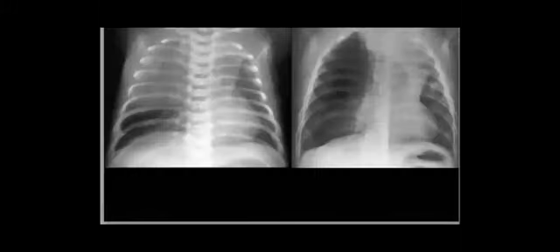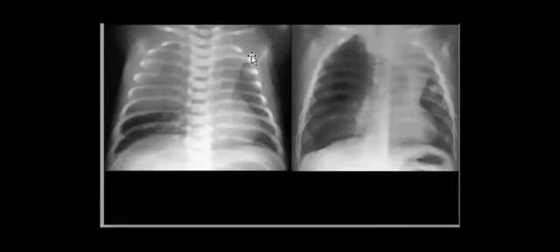And finally, when you find it like this one, and they show you this image, you are talking about congenital lobar emphysema, perfect, Marwa. Yeah, congenital lobar emphysema. It can come to you as opacity first, then in serial images it ends with hyperlucency. So congenital lobar emphysema is one of the good differentials to put. It starts with consolidation and ends with lucency.